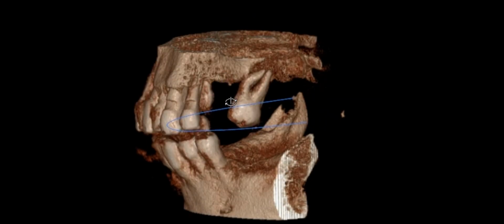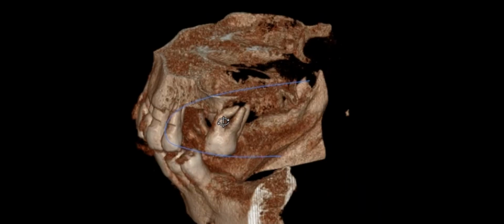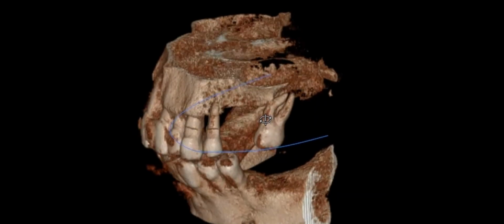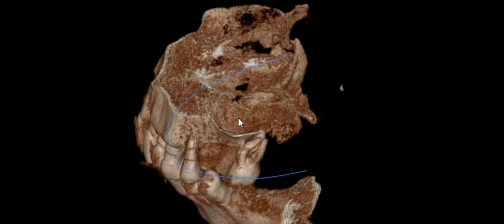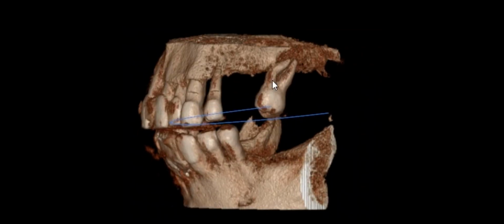And then he's lost several teeth here. And the tooth at the back here also just essentially hanging in by the gum rather than being supported by bone. And what you also realize is that up here is the sinus area of his upper jaw. And if we go to the next X-ray, so up here, we can see that this corresponds to his upper left premolar, and the bone is lost essentially to the tip of the root.